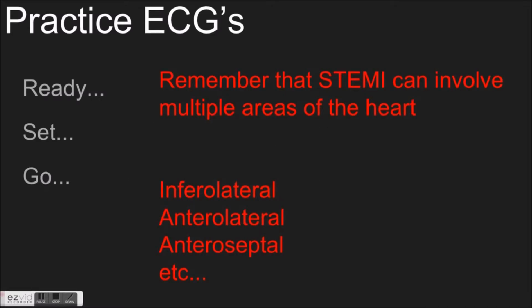Couple of things to remember when you're practicing with these EKGs. STEMI can involve multiple areas of the heart. So it doesn't have to be just an anterior or an inferior or a lateral or a septal, right? You can have an inferolateral, anterolateral, anteroseptal, different things, all right? Contiguous leads. So just remember that.